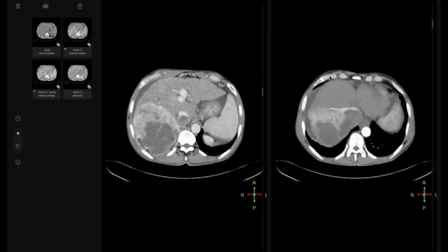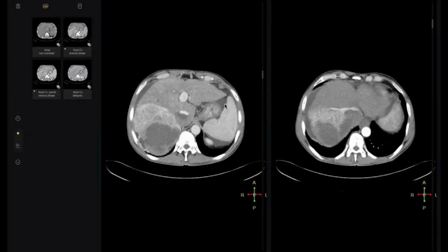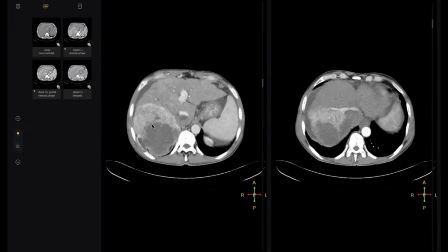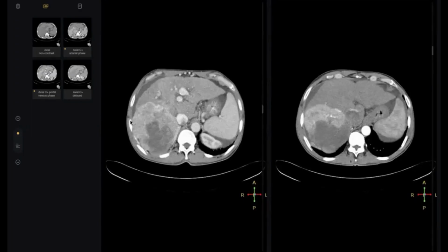Can I ask a question? Okay, but please, an easy question. I just want to ask about the liver biopsy approach you were talking about. We are trying to use either an anterior approach or a lateral approach according to how to avoid the vessels. In this patient, if you try an anterior approach from this slide, you will injure this hepatic vein. You will injure this vessel anyway. But from here, we are trying from lateral to avoid any vessel.